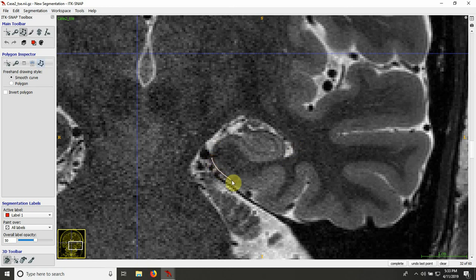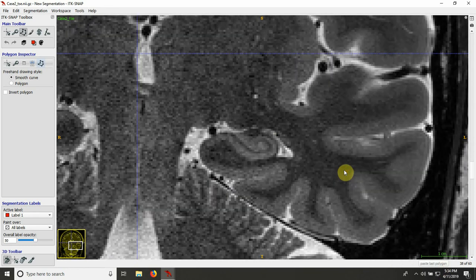So again, I can see the borders, the cortical regions, and the hippocampus, and also this inner dark band. And going a little bit further posterior, it's really sharp here. And also the outer borders, and so forth.